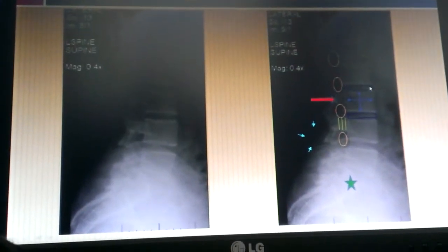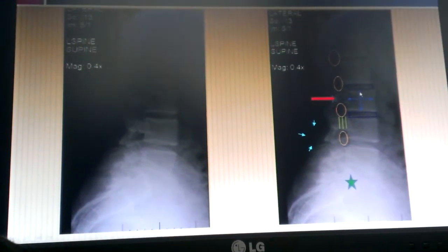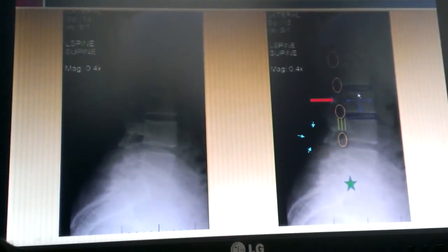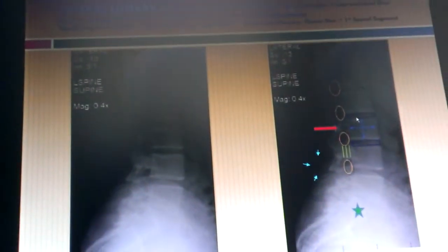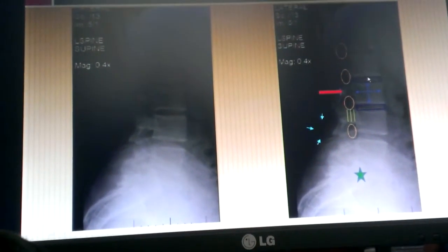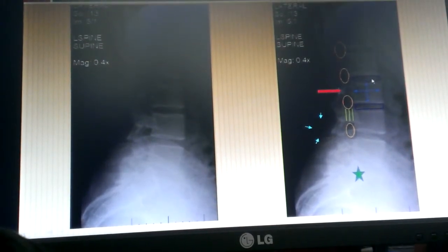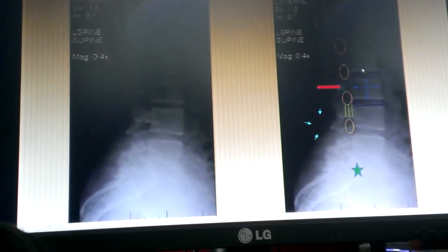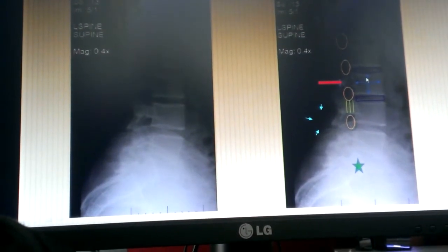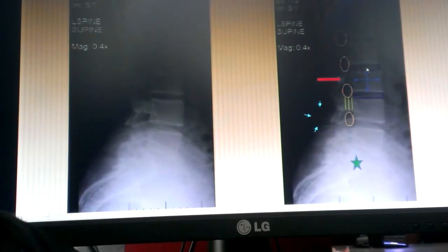This is straightforward. Intervertebral disc, or discovertebral junction. What did I call it? Just intervertebral disc. Sometimes you say discovertebral junction, or intervertebral space, sometimes they have disc in there, sometimes they don't.